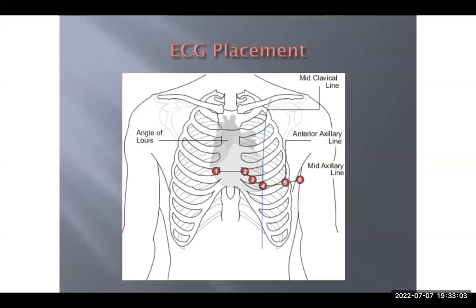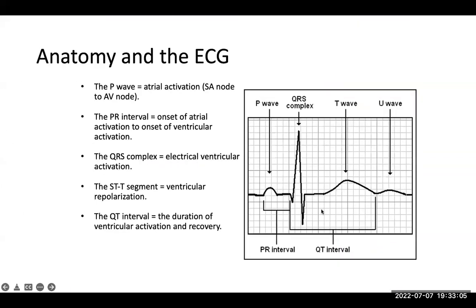They are not bipolar. Now, in terms of anatomy, of course, not all waves must always be there, but basically it usually starts with a P wave. Then we have got the QRS complex. We just call it a complex because it's not a must you have a Q. It's not a must you have an R. It's not a must you have an S. You can have QS, you can have RS, you can have QR, etc, etc.